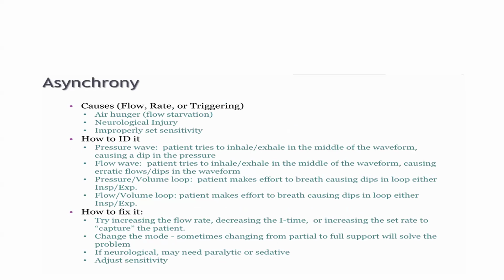How to identify it? Pressure waveform. The patient tries to inhale and exhale in the middle of the waveform, causing a dip in the pressure. Flow wave. Patient tries to inhale, exhale in the middle of the waveform, causing erratic flow and dips in the waveform.